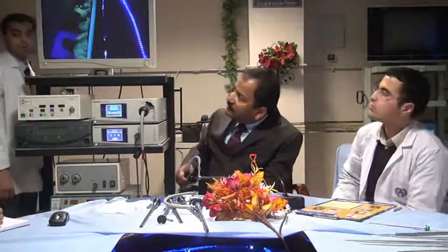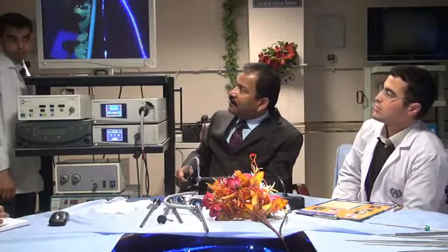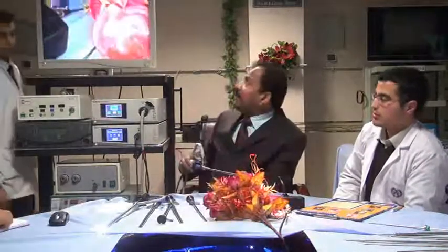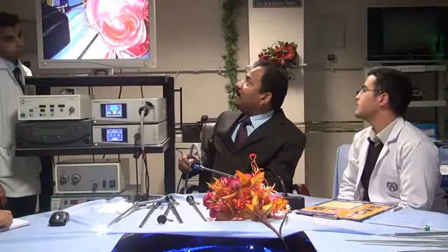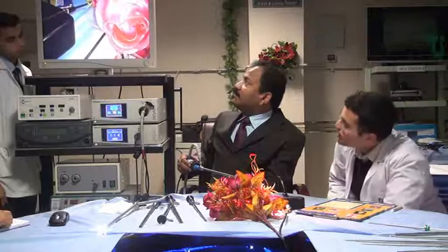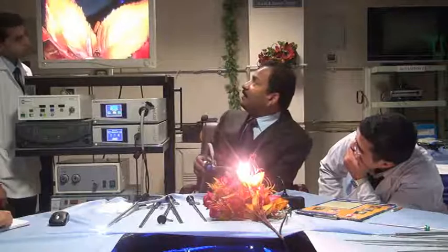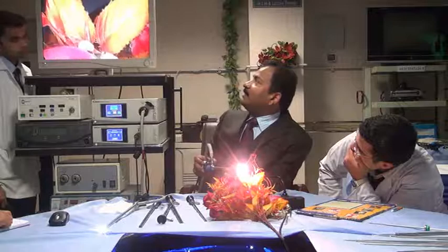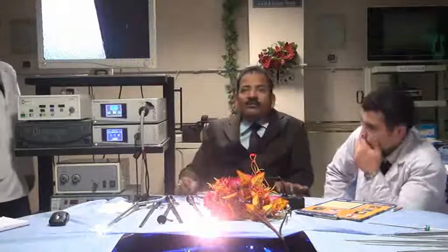light on color. This flower is looking like a flower, isn't it? But if you see this one, this flower looks like a cloth. If you see very carefully, all the fabrics are visible, isn't it? If I show you this leaf, you can see the fabric. So anybody can say that no, this is not a natural flower, this is an artificial flower. Because pixels are more, so information is more.